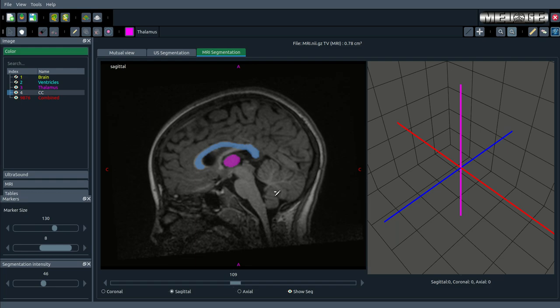Actually, segmentation in Melage is a robust process that can be tailored extensively with the right tools. By the end of this tutorial, you should be familiar with the essential functions needed to perform effective segmentation. Remember, each step and tool usage can be adjusted based on your specific project needs, ensuring flexibility and precision in your imaging work. Thank you for choosing Melage, and I hope this tutorial helped you streamline your segmentation tasks effectively.